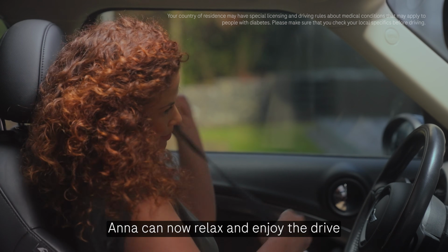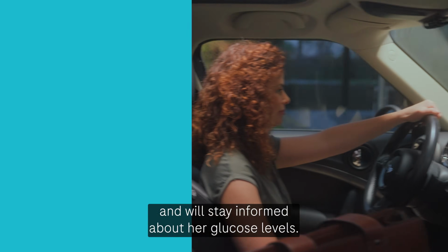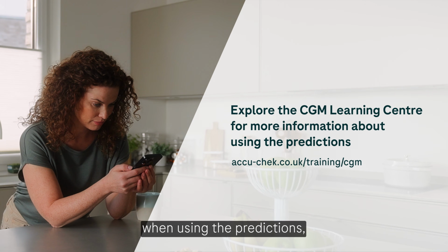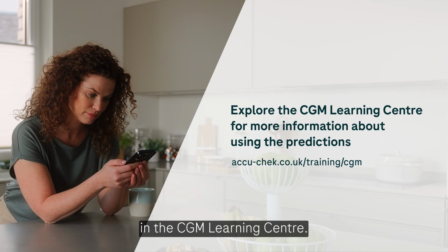Anna can now relax and enjoy the drive, knowing that she has prepared for the journey and will stay informed about her glucose levels. You can find information about what to consider when using the predictions, including situations when they might be less reliable or unavailable, in the CGM Learning Centre.